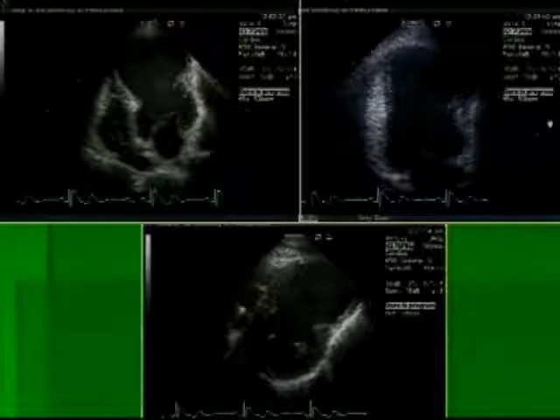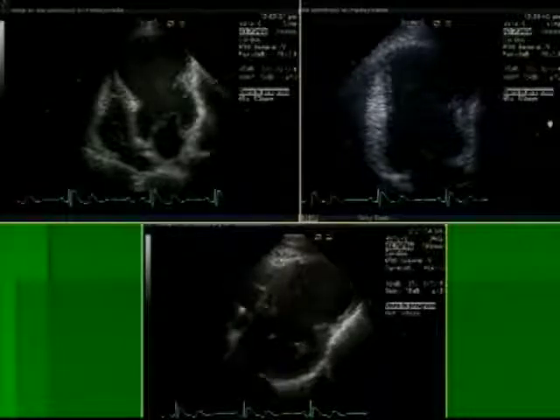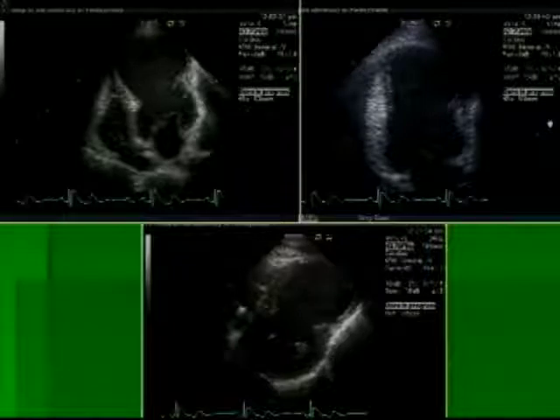Here's another example. You can imagine that this patient would definitely have a predisposition to forming a mass or a thrombus within their heart. You can see the apical four-chamber view in the upper left-hand corner there. There's a massive aneurysmal dilatation of the mid-ventricle all the way to the apex. That's shown in a two-chamber view, somewhat zoomed in, in the upper right-hand corner.